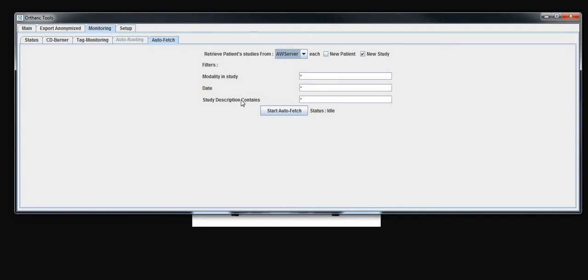This is the most advanced feature of the application, so do not hesitate to contact me if you want more information, help, or even if you want to build new services on this monitoring feature that could evolve. For example, I have a project to make an auto routing application, but we can imagine also several other applications using the power of Orthanc.